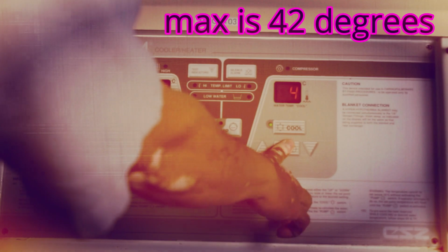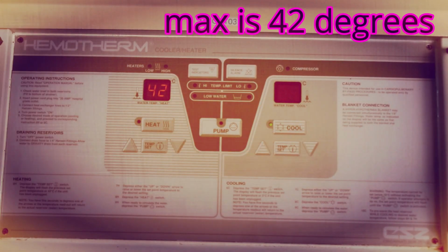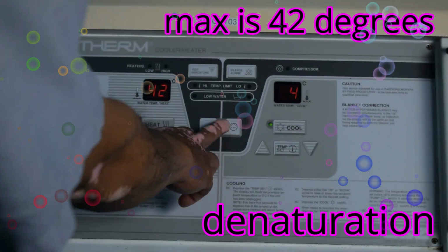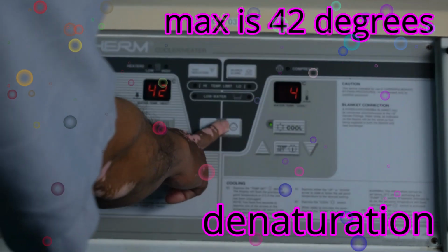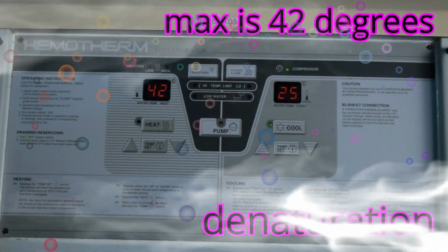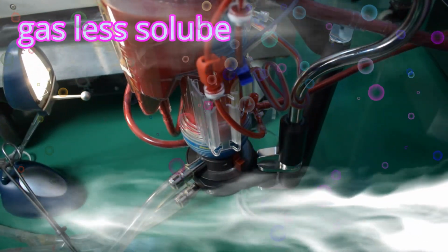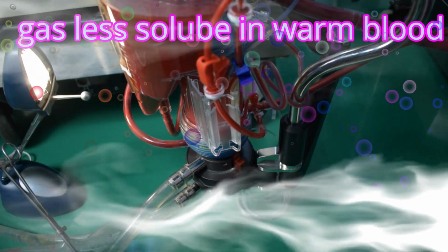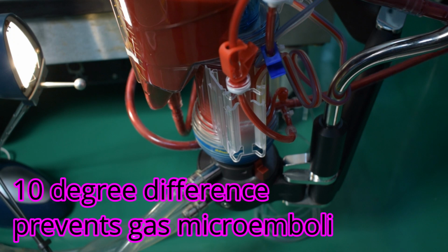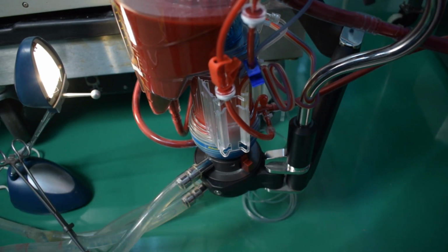Blood damage in the form of protein denaturation limits the absolute maximum temperature to 42 degrees centigrade in this hemotherm. In addition, the maximum difference in temperature between the water and the venous blood is limited to prevent bubble formation due to rapidly decreasing gas solubility. The gaseous microemboli formations can be avoided by limiting the water and blood temperature difference to 10 degrees centigrade.